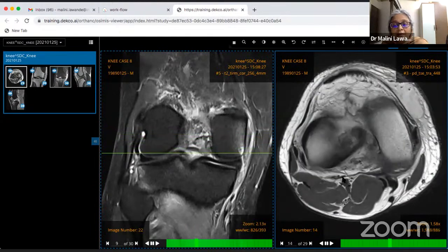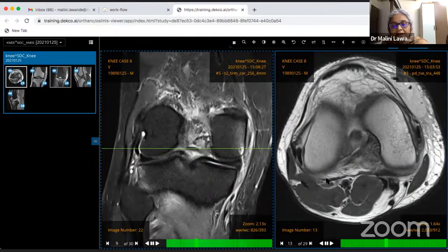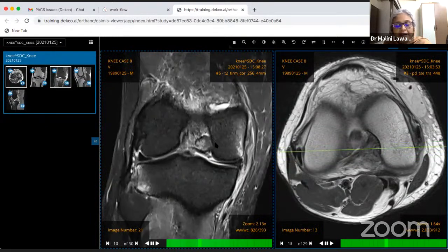Plus, we were looking at the lateral capsule, and we saw at this particular section, there is a lateral capsular injury. See how this black line is seen well here, but at this section, it's not seen well. So there is posteromedial and posterolateral corner injury. But remember, on MR, this edema exacerbates things, like we overestimate things in acute conditions. So you have to correlate MR finding and the clinical examination. But the important thing here is for you to make sure that you are checking for the posteromedial and the posterolateral corner structures too.